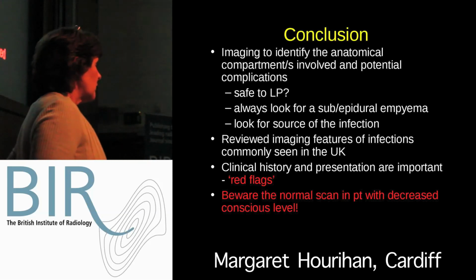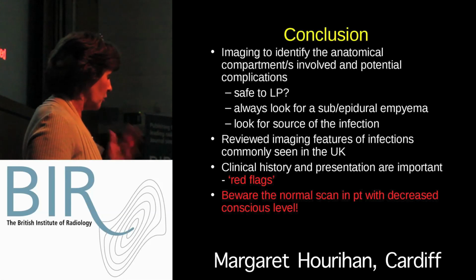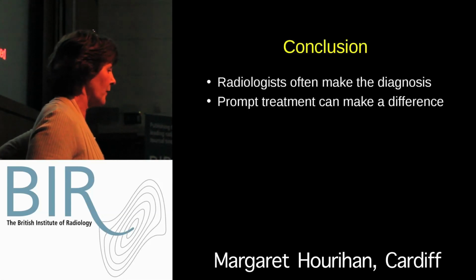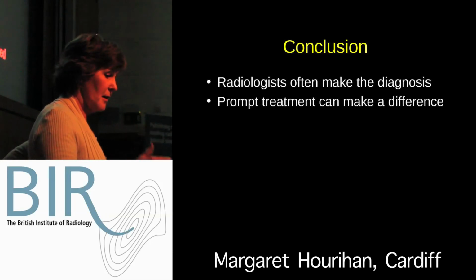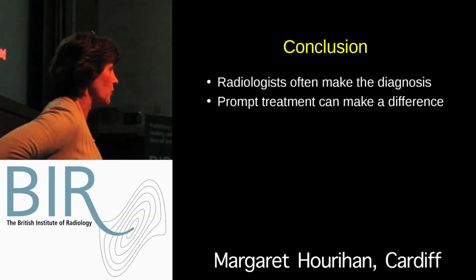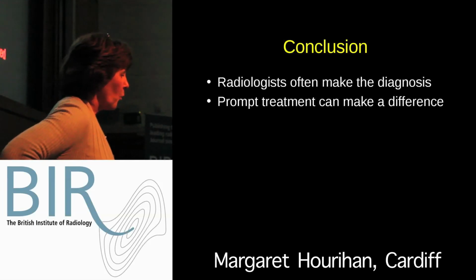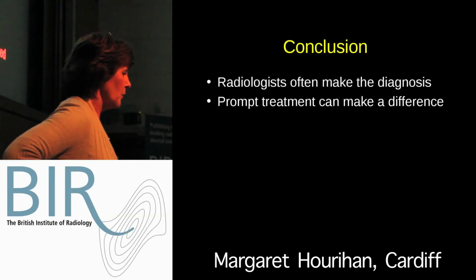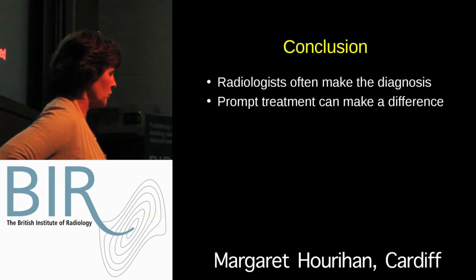So in conclusion, what I hope we've done is we looked at the imaging to identify the anatomical compartments involved with infection and the potential complications. On the question of is it safe to LP, unless there are contraindications, yes it is, you don't have to get up at 3 o'clock in the morning. If there are any red flags, then look for subdural and epidural empyemas, because otherwise you might miss them, and look for the source of the infection.